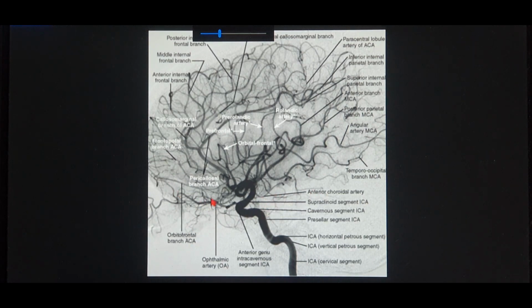That's the ophthalmic artery over there. Yep, that's the ophthalmic artery right there. So it's very easy to localize the ophthalmic artery on a scan. So that's the ophthalmic artery. This is a very important photograph, so I hope you take a screenshot and read that at your ease.